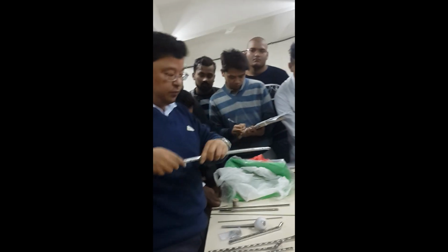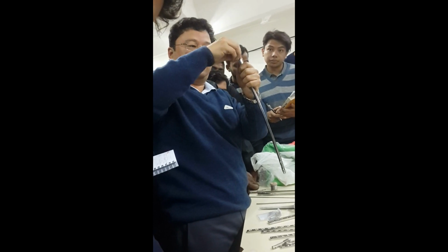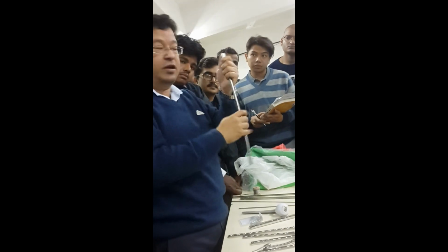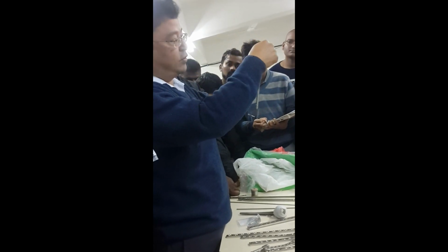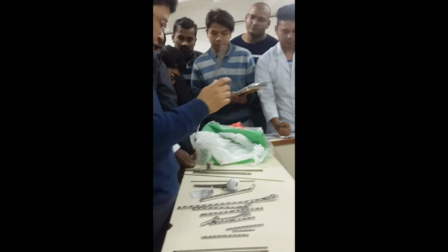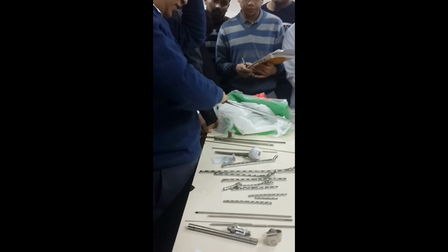Before putting a femur nail, you just cannot put it with the hand like this. There is an instrument which comes here, the zig, fixed like this, for you to hold and push it down or hammer it. For the zig there is also a thread inside, so it locks. That part you don't need, but if they ask you what this is for, this is for the zig.